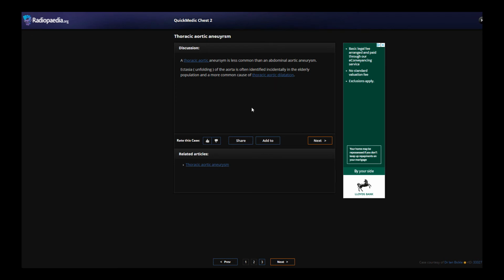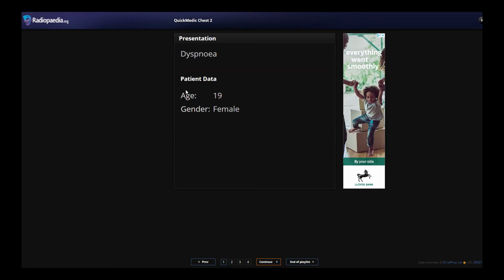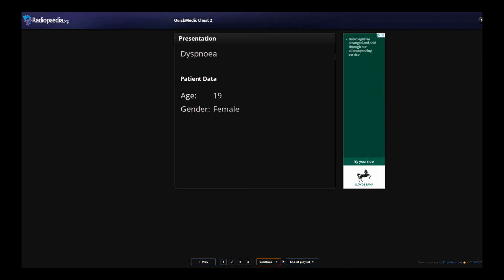Moving on then, our next patient is complaining of dyspnea. She's a 19-year-old lady.